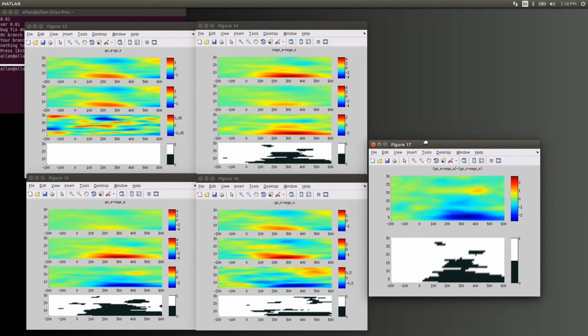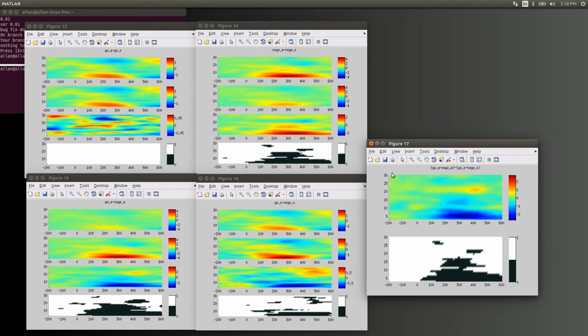And then we finally have the interaction, where again you have the frequencies on the y-axis, the same time scale on the x-axis, and instead of showing condition waveforms, we just show the difference. So this plot that you're looking at here for the interaction, this is the difference of the differences. Okay, so it's go alert minus no go alert minus go sleepy minus no go sleepy. The difference of the differences. That's basically what the interaction is.